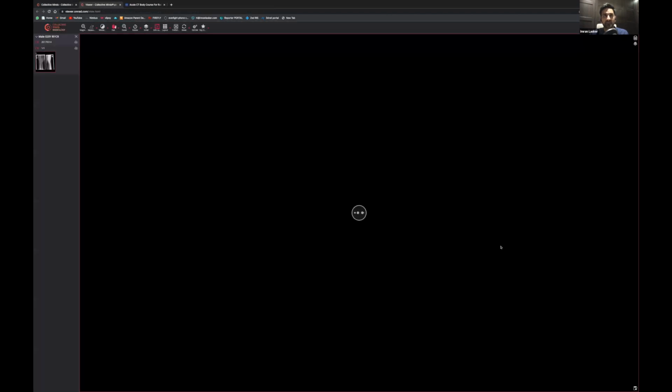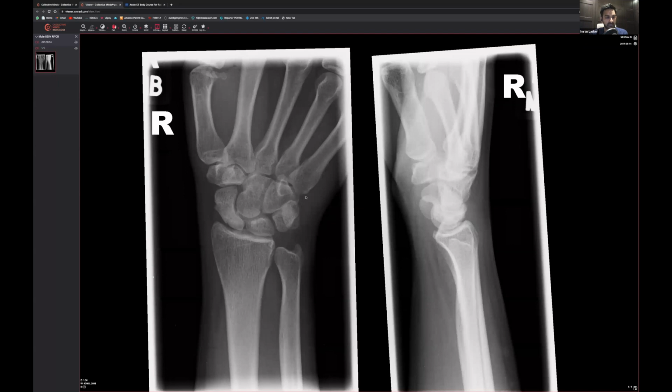Okay, so thank you for commenting and getting involved in that. That's really useful, actually. Okay, so let's have a look at this x-ray.